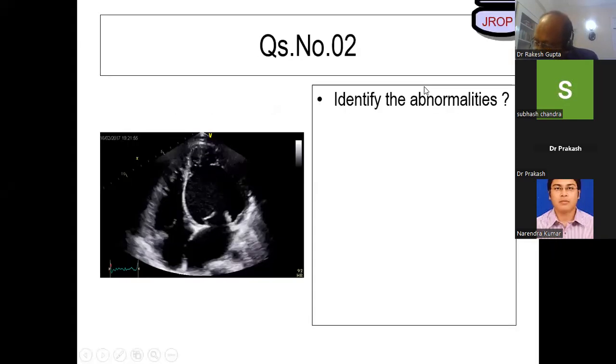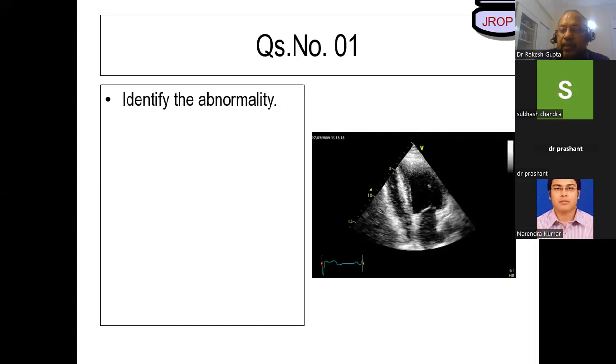My question goes to Dr. Parveen Kumar from Danapur, Patna. Parveen, are you there? Dr. Prashant Pandey from Varanasi. Prashant, are you there? Yes, sir. Okay, tell me the abnormality in this patient.